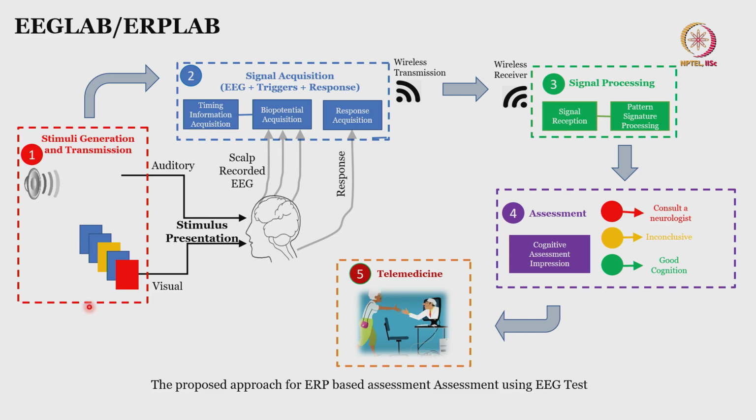But for now, for the code walkthrough, this is an experiment conducted to assess working memory and attention, measured using the P300 event related potential, which occurs when you have three types of images: standard, target, and distractor. The subject is asked to click a mouse or count the number of occurrences when target images come. Let us say in this case the red rectangle is the target image, and in between the yellow image also comes.